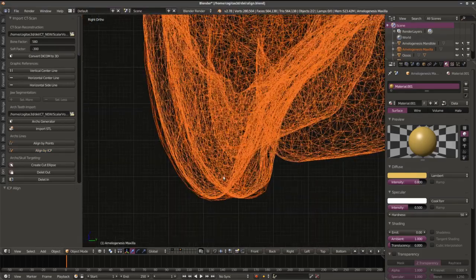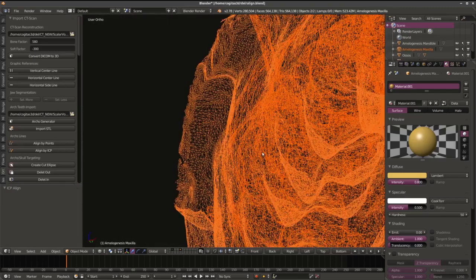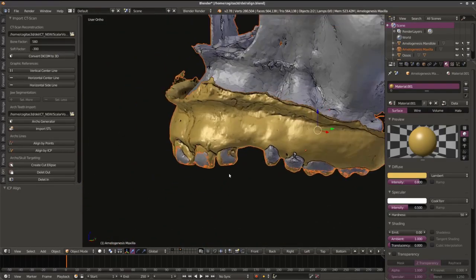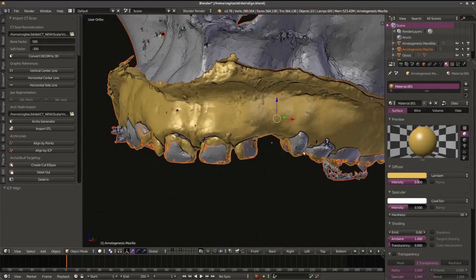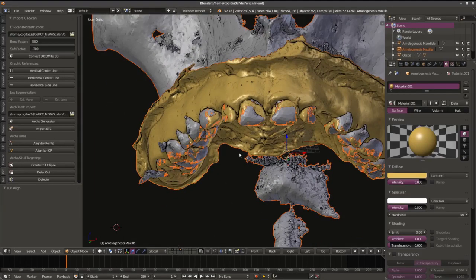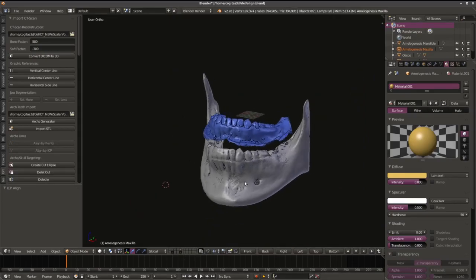Well, I clicked some times and I saw that the CT scan has a bigger mesh than the mesh scanned by the scanner. Okay, so I think it is because the scanner has more resolution, right? And we can see here that it's all well aligned. It's sufficient to use in this project, in this work.